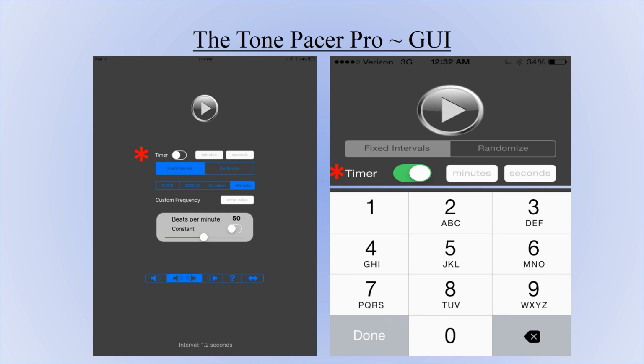So to activate the timer function, slide the button till it turns green, tap on either the minutes or seconds field, enter your time required. Typically for many of the applications we use 90 seconds. Hit the Done button and you're ready to go. To start the application, hit the play button on the pause play button at the very top of the application.